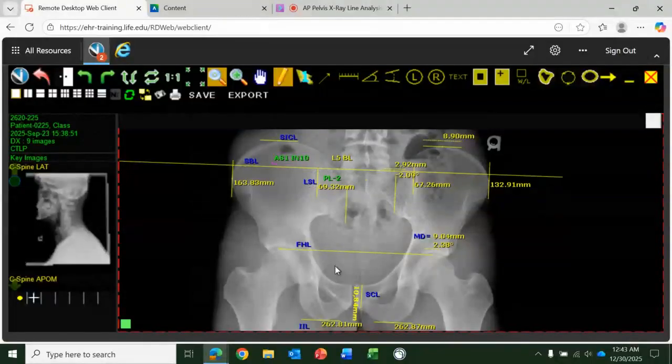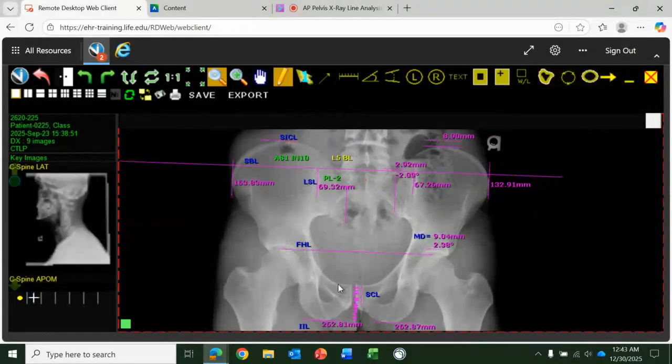We have an AS1, since this number is smaller, IN10. We're rounding these up because they are so close regarding their whole numbers. We don't round the others up.